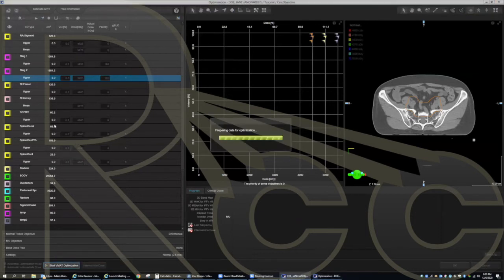The good thing is, if you have the same names, you can actually create scripts for this. You can create scripts in whatever your planning system is and do the different Boolean operators. The margins will all be the exact same depending on your dose level.